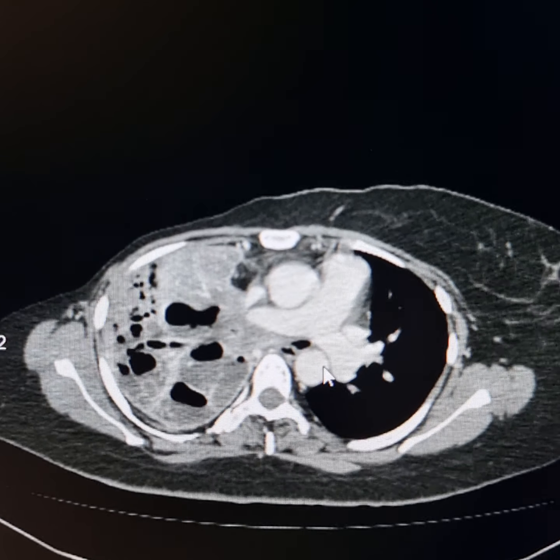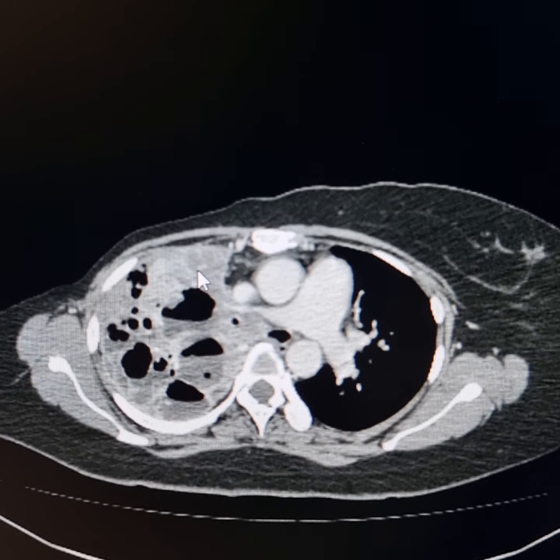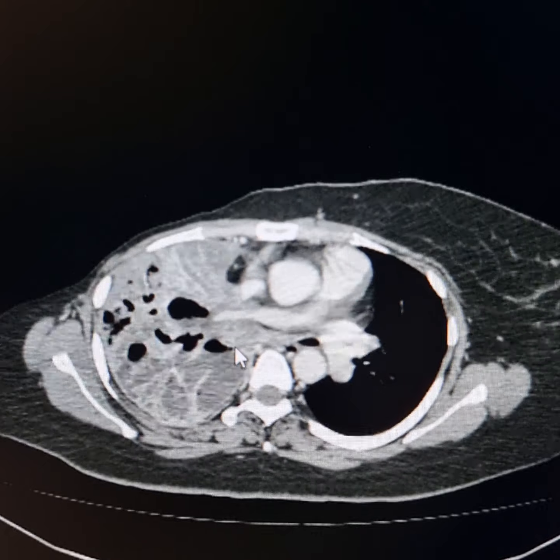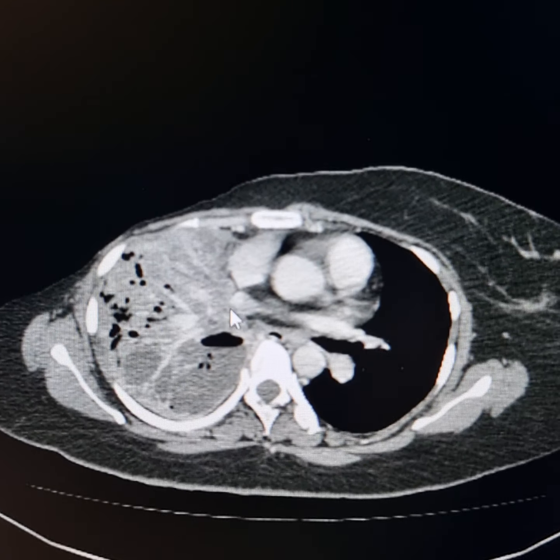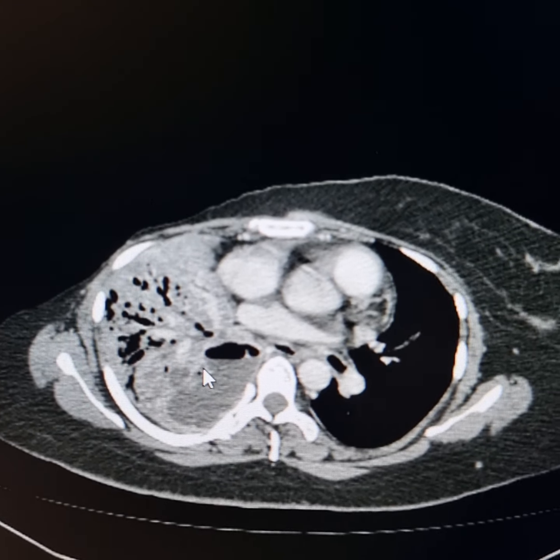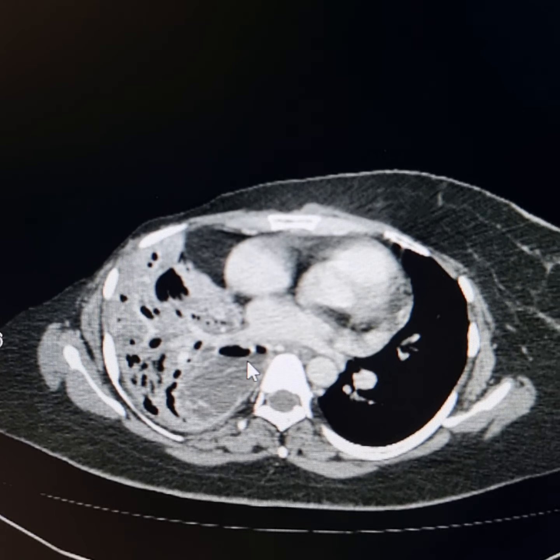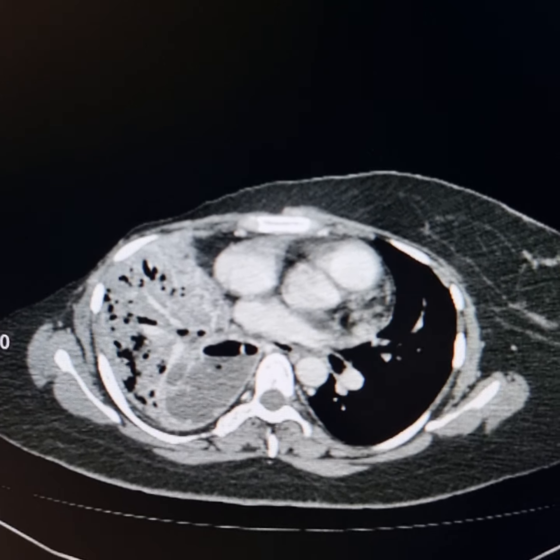This one, and this has a non-homogeneous texture. It is unlike the consolidated lung, through which you can make out the blood vessels passing through. And this is the area of the growth here. And just distal to the growth, again, you find, although it's a consolidated lung, multiple cavities are present, but still you can find the blood vessels wheresoever cavities were not there.